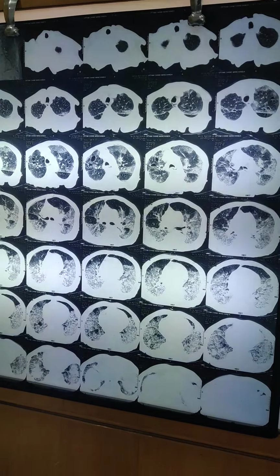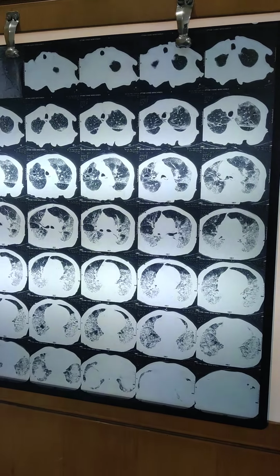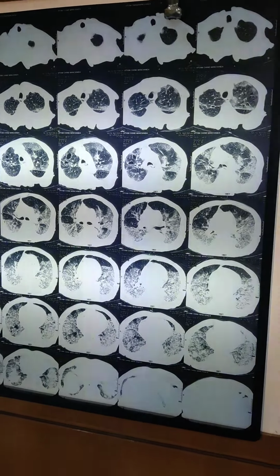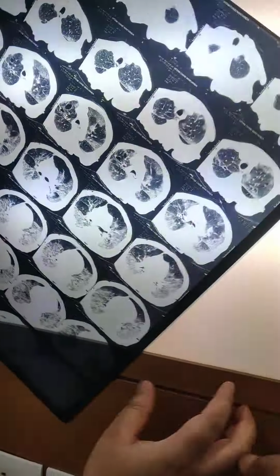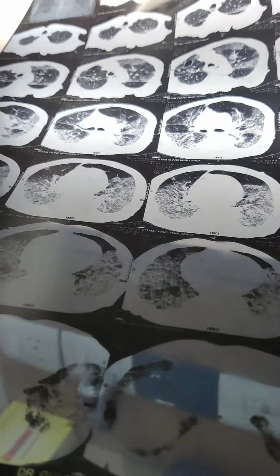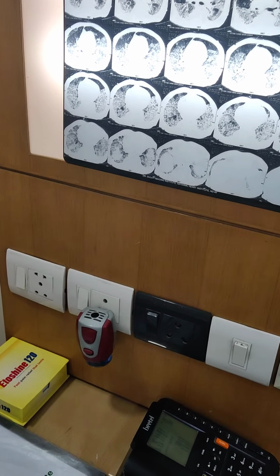Very interesting. Now when the COVID hits the lungs, these are the changes you should look for as a student because of inflammatory. Now what we are showing here, Naren, just point out the ground glass appearance. Just show what are our ground glass. Now what you typically see is, the way you break a glass bottle, that is the look here. You see this typically ground glass appearance. So ground glass opacity, what we call ground glass opacity, GGO.